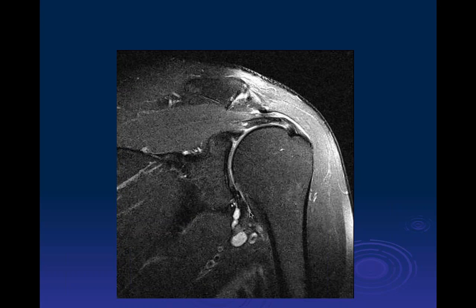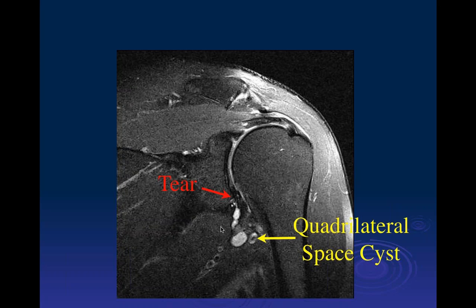Right, okay. Here's just another example of an inferior labral tear. It's a little hard to see the tear itself, but you can infer it because this paralabral cyst is classically seen only in the presence of a labral tear, where joint fluid goes through the tear site, which is here, into the paralabral cyst. And these inferior cysts, fortunately, most of the time they're not very large, but when you see these, I guess I should have asked someone else.